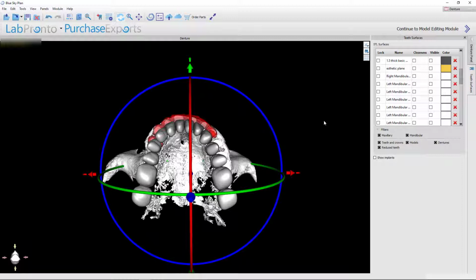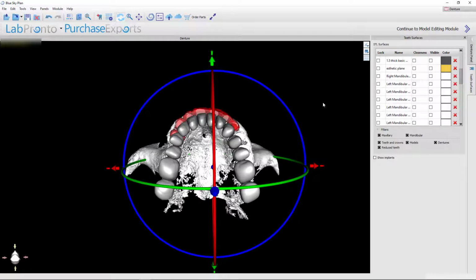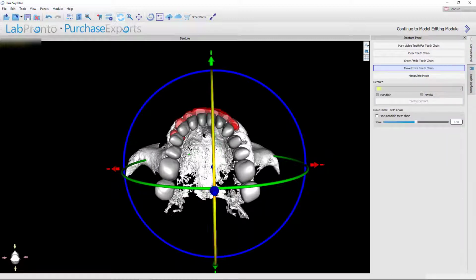So usually, if I'm thinking of setting a full arch of teeth, I'm thinking mandibular stability, I want teeth centered over the ridge. Here, her mandible is crazy, right? It's actually a fibula that was reconstructed because she had a tumor removed, or had her whole mandible removed because of a tumor. And so, in this case, what I would probably do instead is just think about setting it to an ideal maxillary arch of teeth. So I see that it's pretty good on the anterior canine to canine.